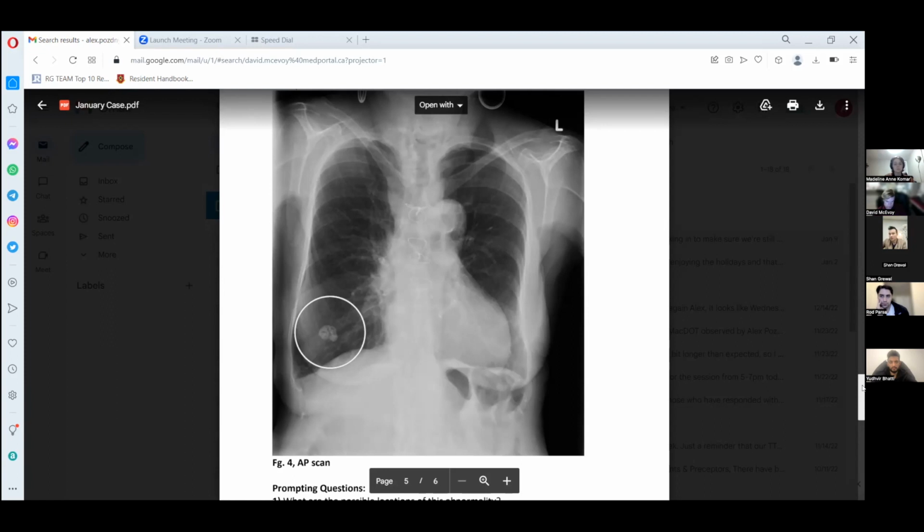But if you are actually interpreting a chest radiograph, it's always useful to mentally go through all your checklists and make sure you don't miss anything, because you'll be surprised, a lot of times you might miss a fracture. For example, I was on an elective in the ICU in medical school, and we were rounding on an ICU patient for weeks.